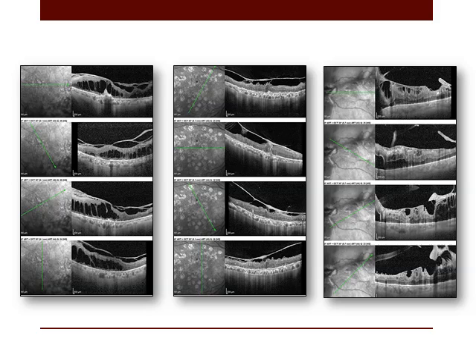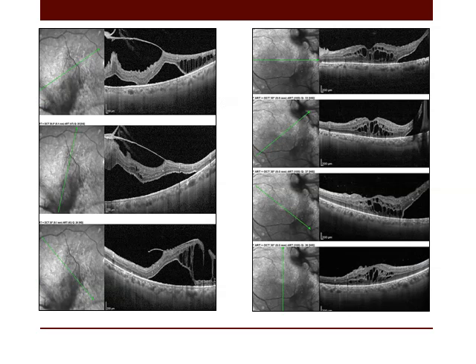Advanced cases of vitreomacular interface abnormalities. Usually these cases will not improve whether with surgery or with injection. Cystic macular changes are evident. These are not vascular leakage but cystic changes. Here all the retinal architecture has been lost. Here there are cystic changes and tractional detachment element, disruption of the architecture of the macula.